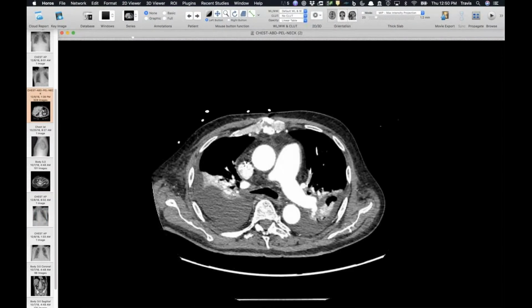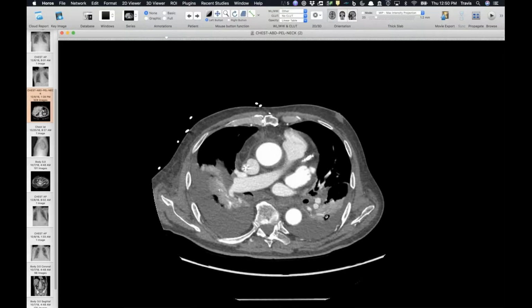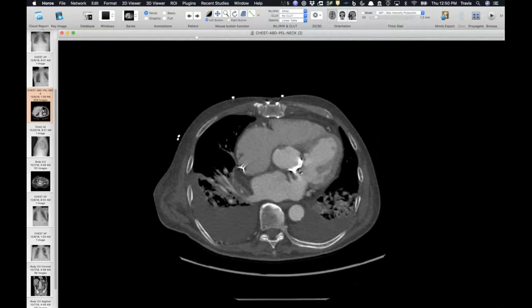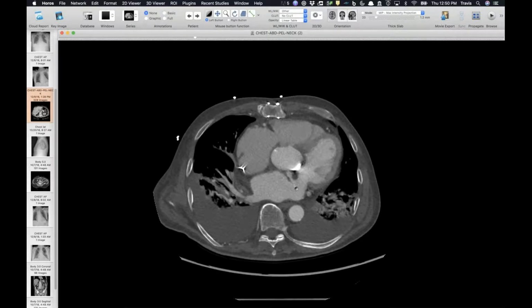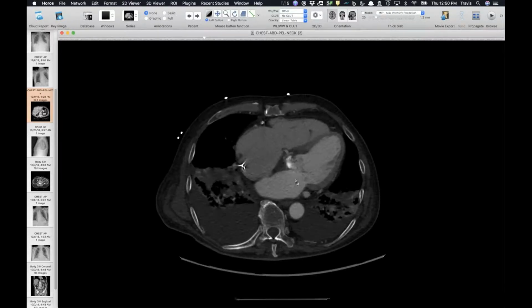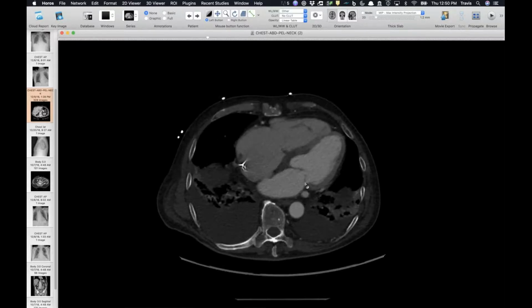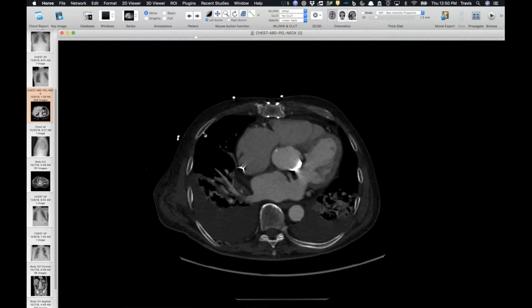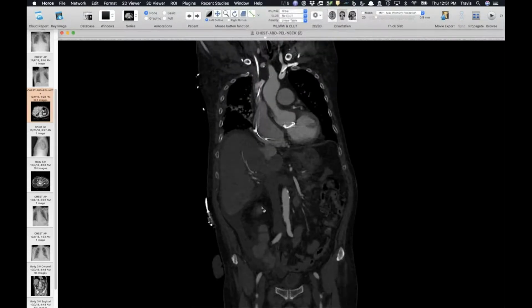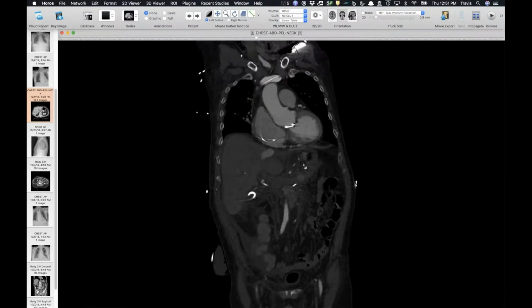Right. And this is the CT that he had shortly after those radiographs, and you can see he's got a lot of volume on board now. And the aortic valve prosthesis, not surprisingly, there's a big vegetation surrounding it. But not only that, you can see there's not one, but two fistulae. There's one to the left atrium right here, where you can see there's a channel right there, and a second one right here to the right side, to the right atrium, kind of right near the tricuspid valve, the septal leaflet. And the valve, this was not a gated study, but just by definition, this thing is at least partially dehisced based on the change in angulation.